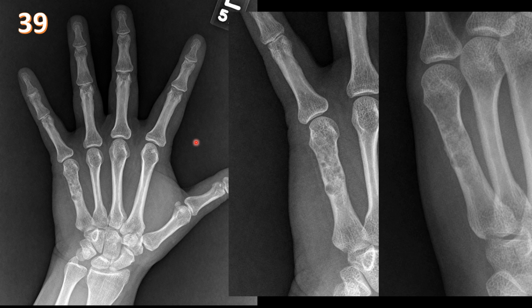So here we have a hand with another enchondroma. This one is single and not multiple, like Ollier's and Maffucci that we mentioned before. So we're going to dig deep into enchondroma. So enchondromas are common in the hand. They are chondroid lesions. They are benign. They are lucent. They can have endosteal scalloping, and they make the bone weaker in the phalanges and metacarpal bones, so it can be associated to fractures.